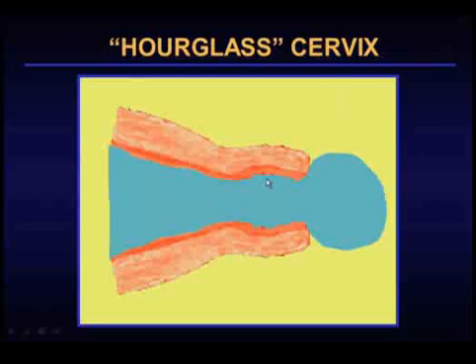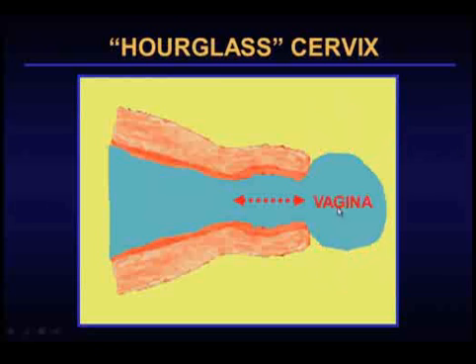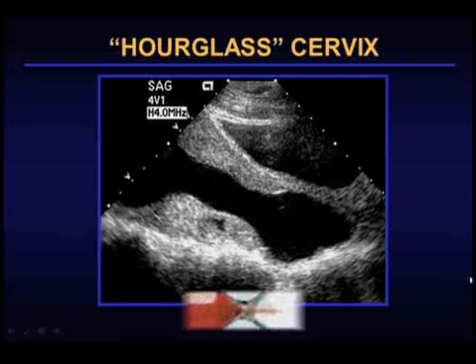Now, sometimes the cervix has an unusual shape, known as an hourglass cervix. What happens here is that the cervix is completely distended, but it's not all that dilated because fluid herniates out, where the membranes herniate through the external os into the vagina. So now the vagina contains membranes herniating through with fluid, and it has a greater ability to distend than does the cervix. So the cervix may be rather non-dilated compared to the fluid in the vagina. Hence, you get this more or less hourglass configuration.